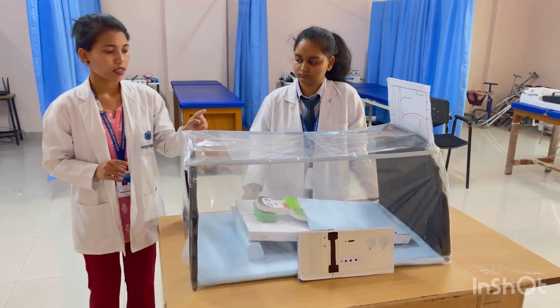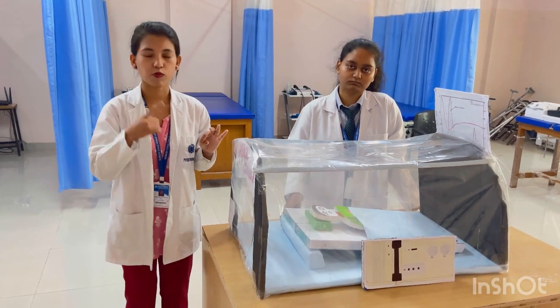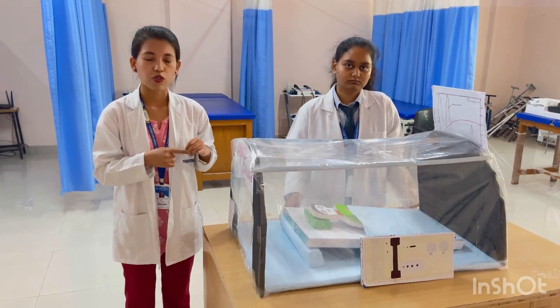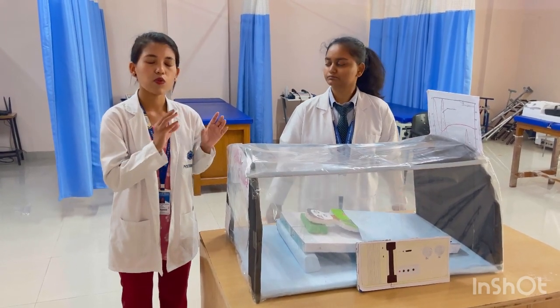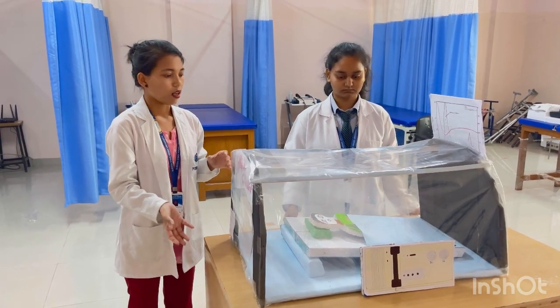We use this therapy for patients who have severe anemia, brain abscess with pus formation, arterial gas embolism, radiation injury, crush injury, and for diabetic patients whose wounds take a long time to heal. And we should not use it for patients who have a pneumothorax problem, as it can cause lung collapse.